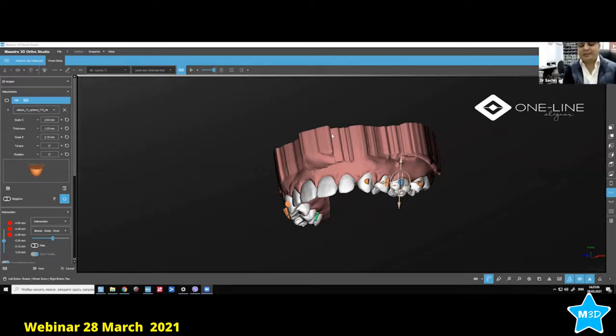The only problem with negative attachments is that printing errors might come up when you make the sheet. For example, you have made a 1.2 negative attachment, but in the sheet it will not be 1.2, it might be 0.2 or 0.3. That's a big problem. You have to find exactly how much you want it to go inside. Maybe this will be better in the future with printing. Yes, with the printing it will be pretty good.